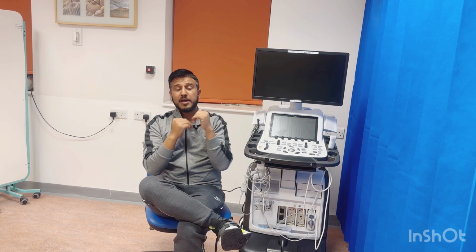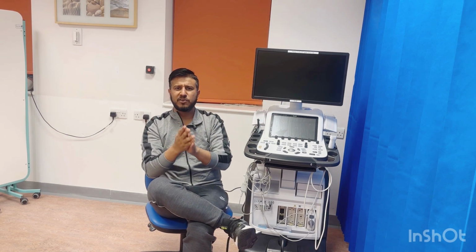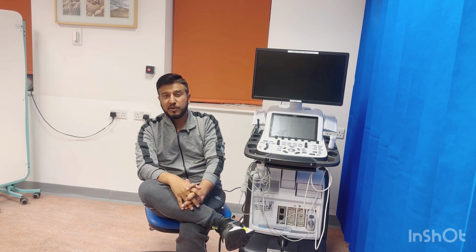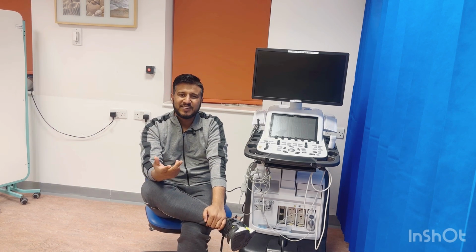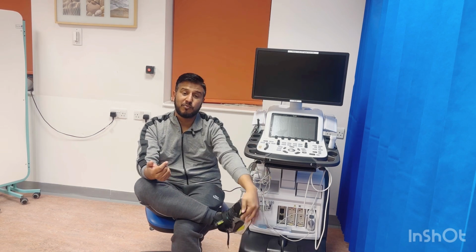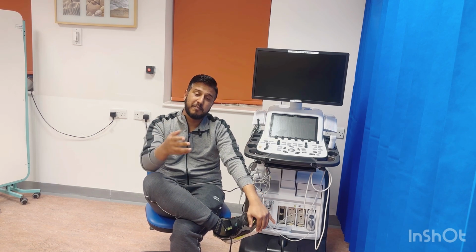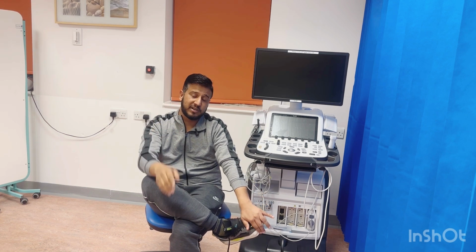That's another thing. Even in normal cases, like someone showing mild AR and everything is fine, they measure the pressure half time very well. But if you look at the Doppler peak velocity and you see only 2.5 or maximum 3, it doesn't make sense, because the pressure difference should be high. So you might get a velocity of 4 or 3.5 in diastole. But again, keep in mind that you need to get a good Doppler signal, try to align it.